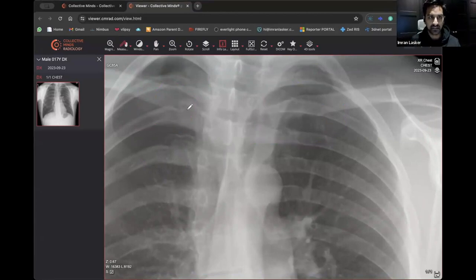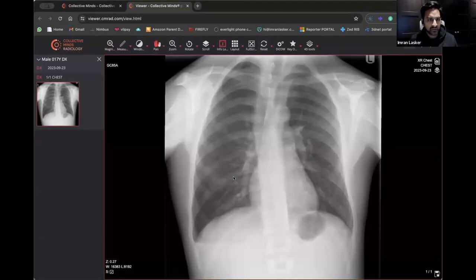And once you do that, you can say, yep, there's definitely a difference in the texture of the lungs there, i.e. there's no lung there at all located within that right apical region. So we could all stop there and say, yeah, we're sorted, it's done now. But actually we do have to think about what else could be happening here.